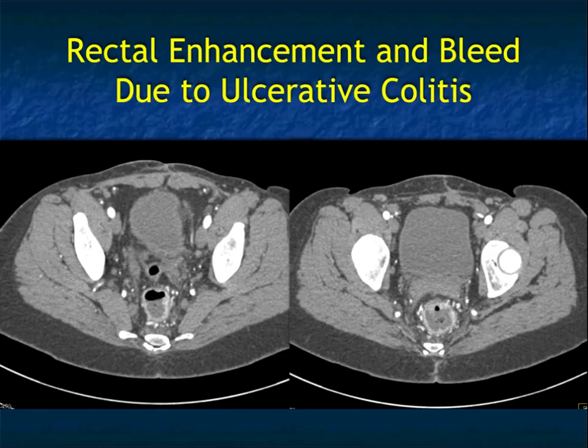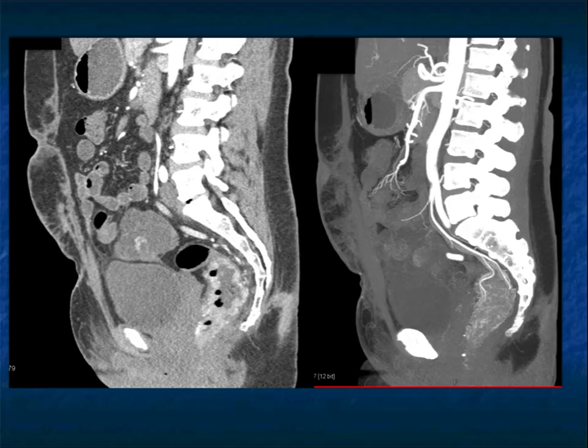bleeding. Now, what's also very important is many times the bleeding will stop, but because CT is so good at localizing the bleeding, the person doing the angiogram, typically the interventional radiologist, will be able to embolize the vessel of concern. Remember, you're there already. You'd hate to not embolize the vessel, and then an hour later the patient rebleeds. So, comfortable with the imaging, many of the senior interventional radiologists will embolize, even though they may not see any obvious active bleeding on the angiogram.